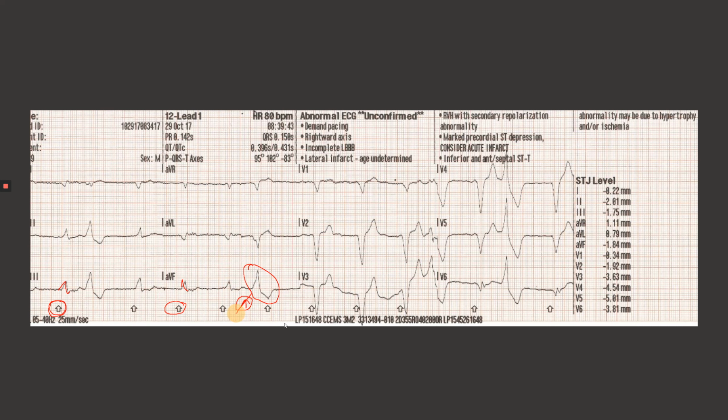So what's happening here? What's happening here is that this person's heart is beating on its own. It's taking some initiative, if you will, and firing off at random times. Now, this can be a dangerous thing, especially if you time it wrong. You can go into a lethal dysrhythmia, which is a lot of work and bad for the patient. So not a direction you want to travel in.